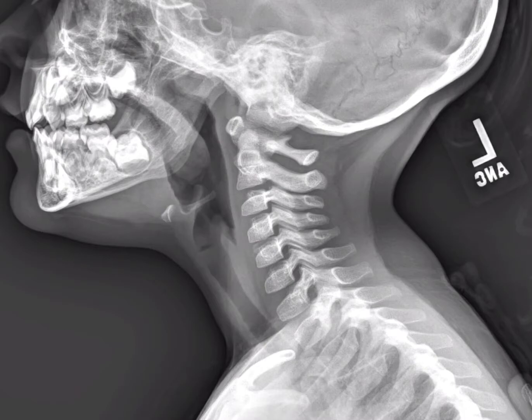In this video, we'll discuss the cervical spine and soft tissues of the neck. Let's start by taking a look at this normal lateral neck radiograph in a pediatric patient. We can assess the alignment of the cervical spine by following the slightly lordotic curvature of four important lines.